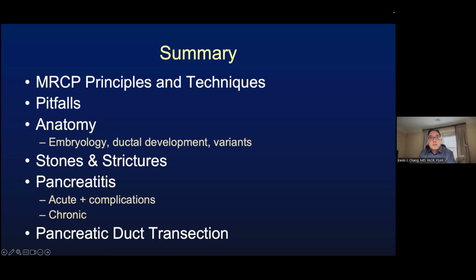To differentiate walled off necrosis from pseudocysts, I look at how complex the collections are, as well as what parts of the pancreas are involved. If I see fat content like peripancreatic necrosis, the fat content within some of these complex collections would tip you off to the presence of peripancreatic necrosis rather than a pseudocyst, because a pseudocyst shouldn't contain fat.